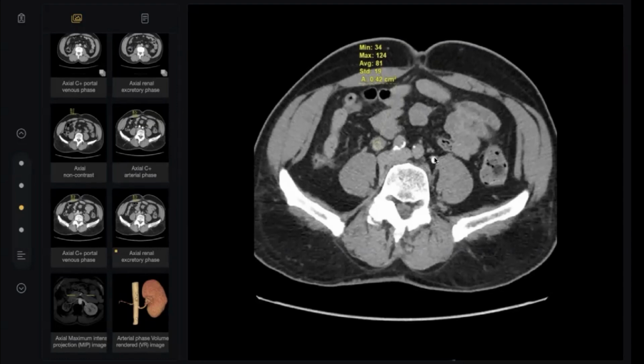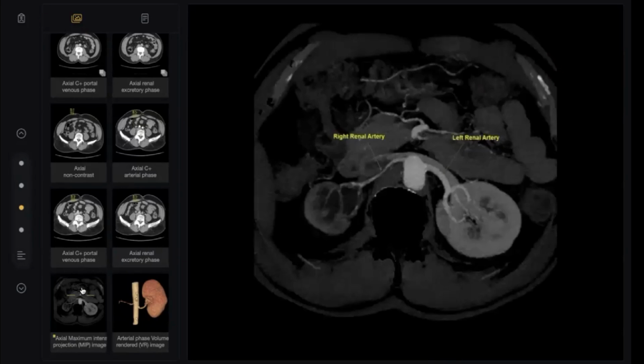This is the left ureter. This is the right. There is a normal delayed excretion on the left side, but on the right side there is no contrast identified within the ureter. So there is an absolute obstruction on the right side. Even not a trace of contrast is seen in the ureter. So the kidney appears to be non-functioning. Okay, look here.